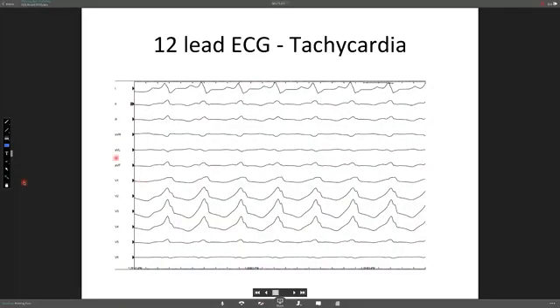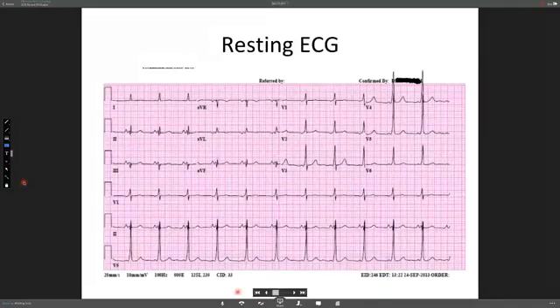Again, sorry, this is just an EP ECG with a different speed. You could see that we managed to induce a pre-excited tachycardia, and this patient was successfully ablated. So I'll just go back to the ECG. Again, this is just a short case.